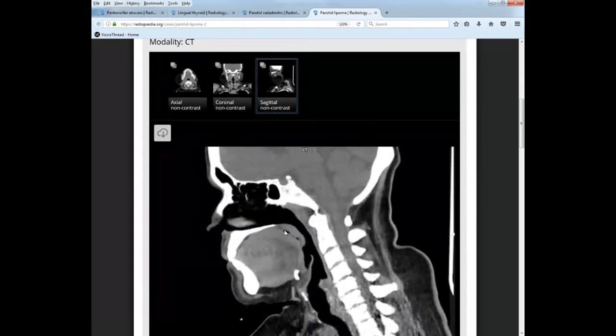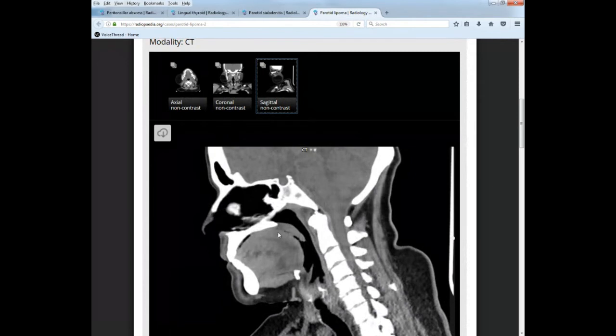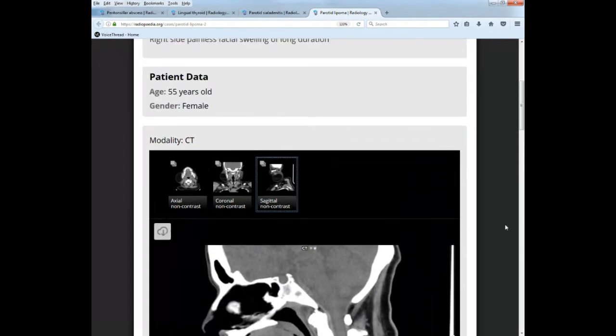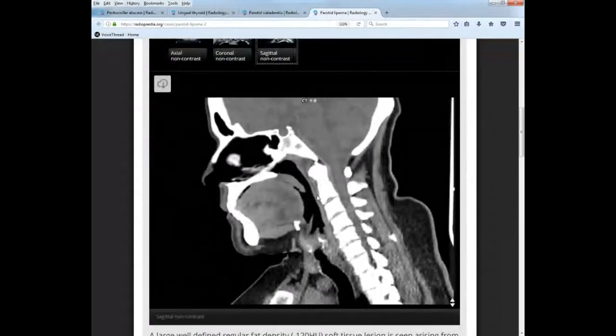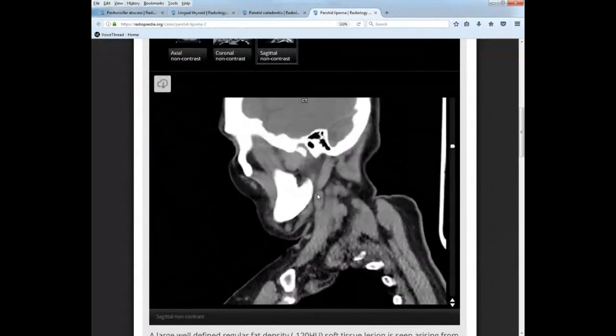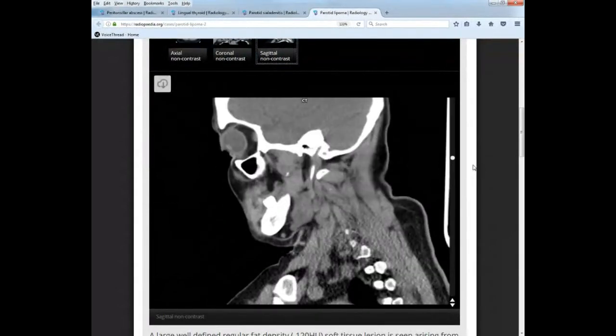You can't see uvula in this patient. And you can't see uvula because this guy has a parotid lipoma. There's a bunch of swelling in here. All right, so now let's look at, make sure I didn't forget anything. Tonsils, vallecula, epiglottis, piriform sinuses.